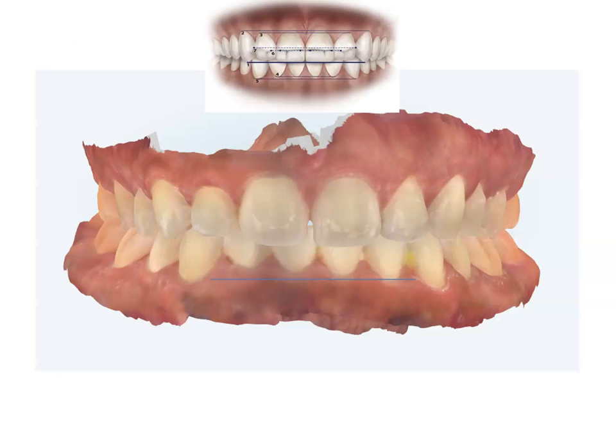Now, if we're looking at the bottom teeth, we can see that the bottom teeth are all skewing up. And if we look at the sharp canines, this is the one that's closest. So we want to bring everything into the zone as close as possible so that they match. Or maybe slightly higher here and then bring all of these. Maybe take the line of the top tooth and the line of the lower tooth and do an average. So some of the teeth will need to go down and some will need to rise up to match up a midline.